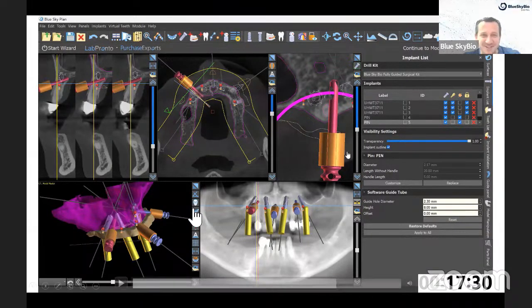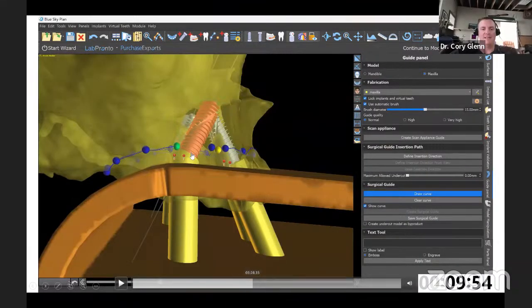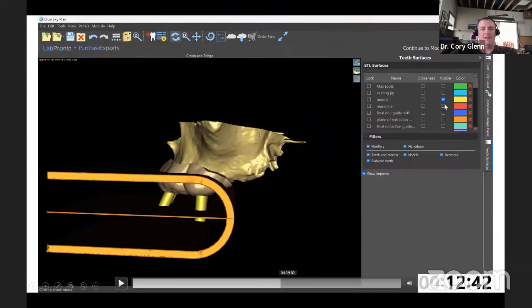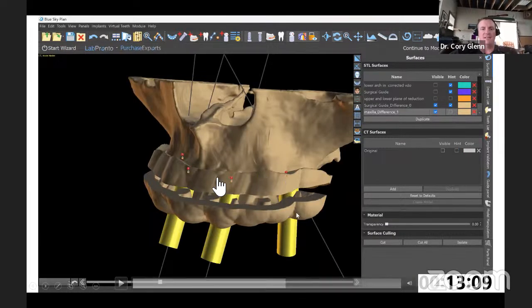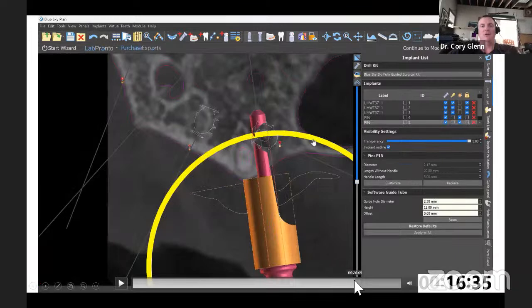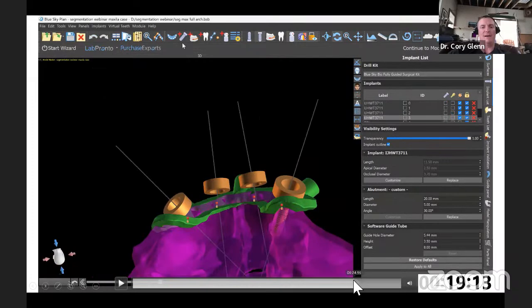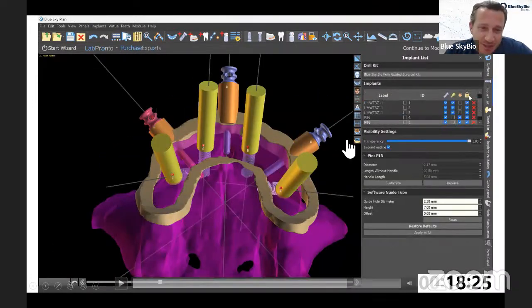Say that again. What's the question? All right, so if I've got a reduction guide here, which has no pin tubes, it's just a reduction guide. And I wanted to now make that into, all right, so you've got just this top portion, but no pin tubes. And then I add pins and I want to incorporate those into that guide. How would you do it? It's kind of crappy to put you on the spot, but I wanted to try it nonetheless. No, what's the issue? You have the reduction and you want to add, okay, and a Boolean.